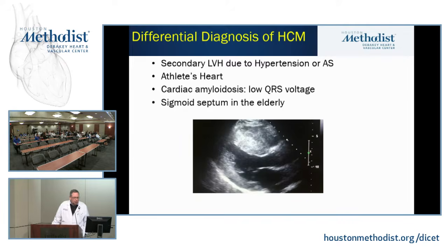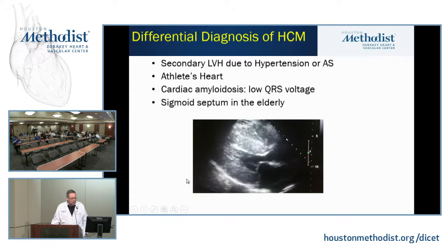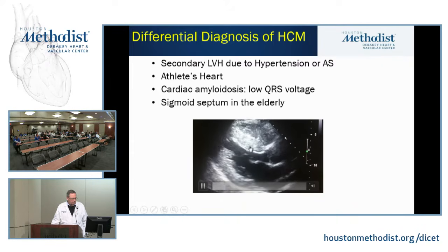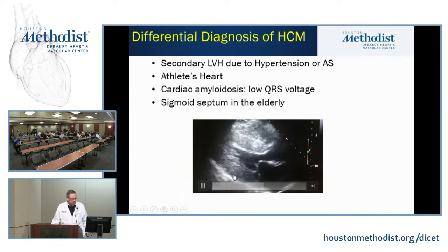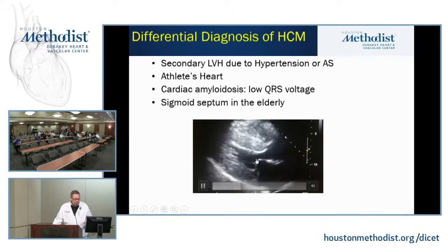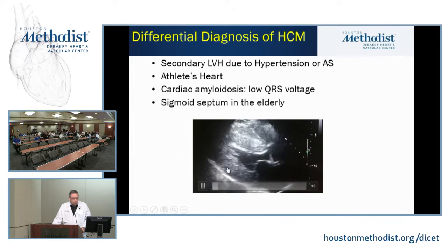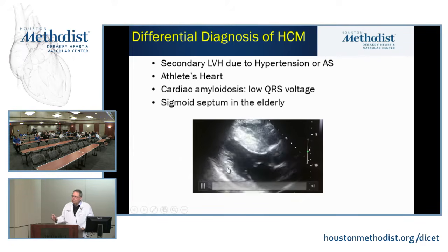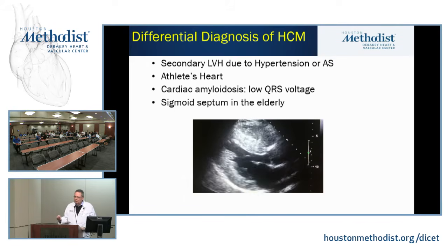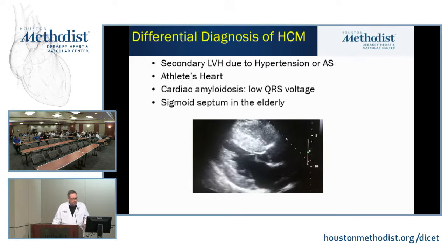Okay, so it looks like non-obstructive HCM, right? There's a lot of asymmetric hypertrophy. This septum is definitely a lot thicker than the base. EF is not that bad. It's not 70%, but it's in the 60s, and there's absolutely no SAM. Now, this could be HCM. Maybe we give a little stimulation with exercise or Valsalva, and bingo, we'll get the SAM. So maybe it is that.